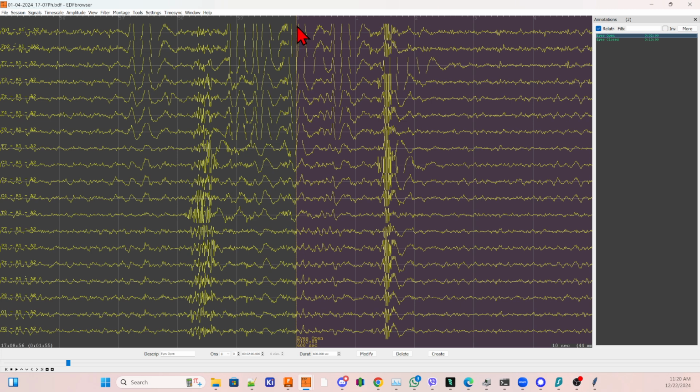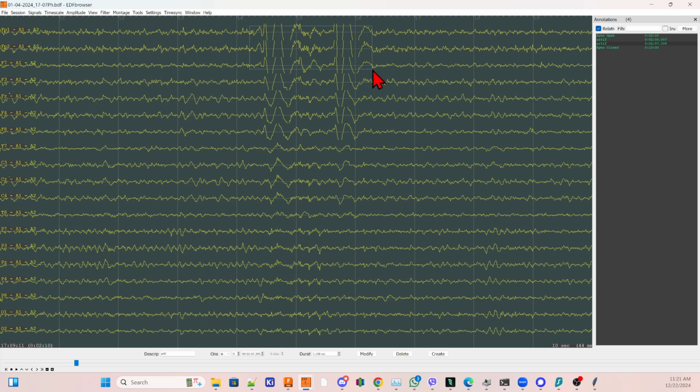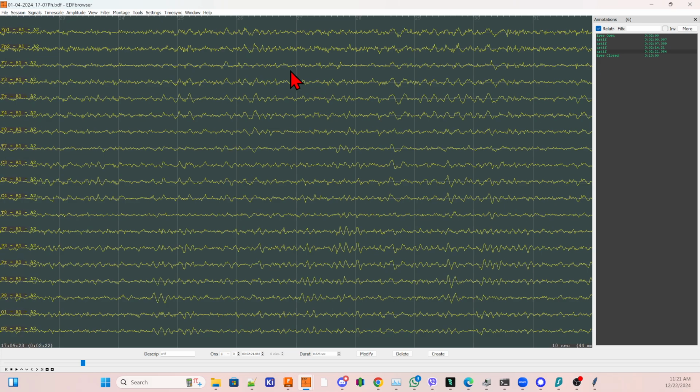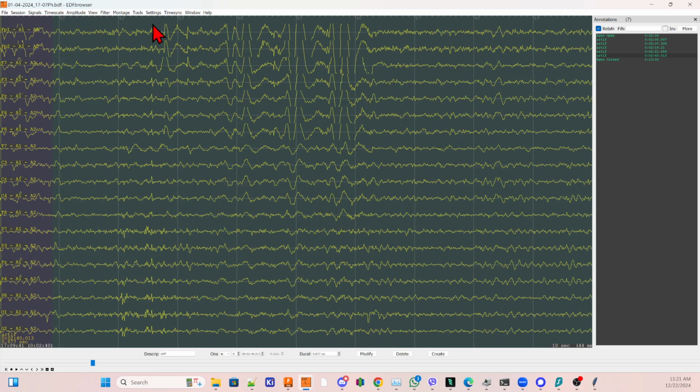And so I'm going to click and drag this period, but I'm doing it while holding Shift. So Shift, click and drag this period, let go, and now Artif. And you could see in that menu the periods that we had predefined earlier are there. So Artif, you can see what I'm doing. Every time before I click the mouse, I hit Shift. So Shift, and this whole period, Shift, and this.